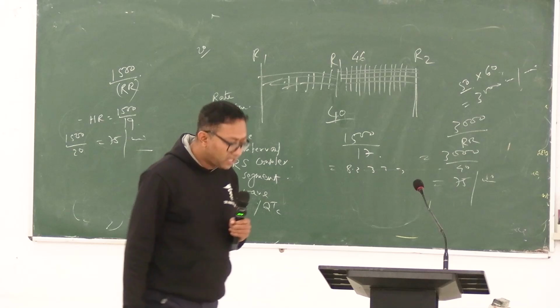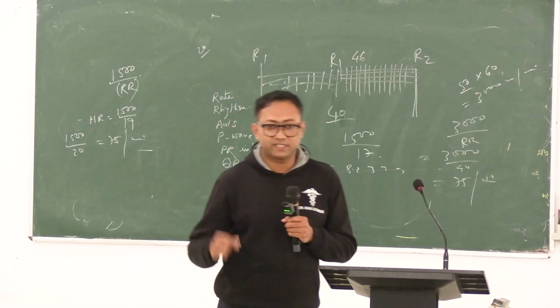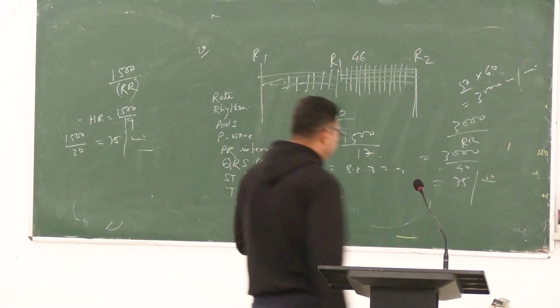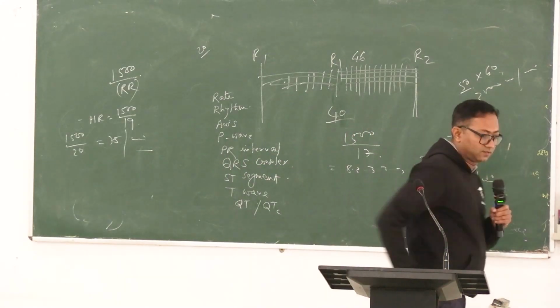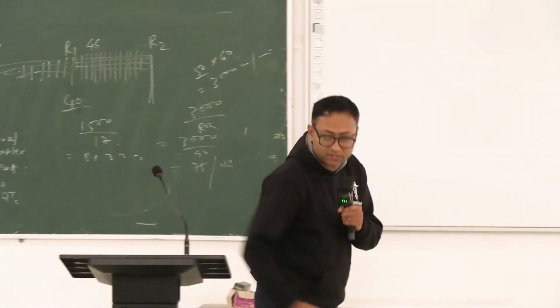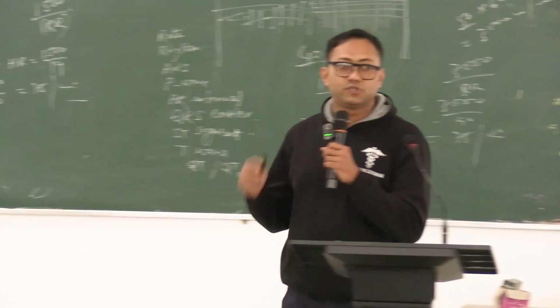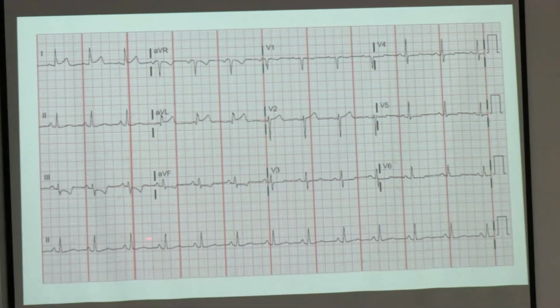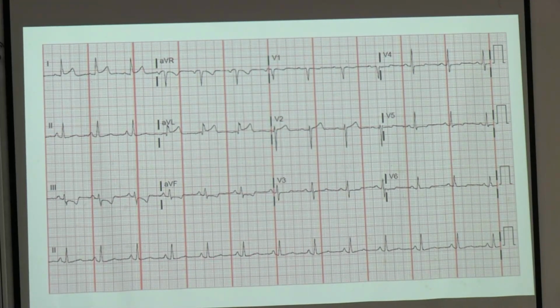Now in this regard, another question may appear, which should have come to your minds. Sir, this is R wave, this is R wave, so R1, R2, R3, R4, R5, R6, R7, like that up to R12, okay? So there are numerous R waves.